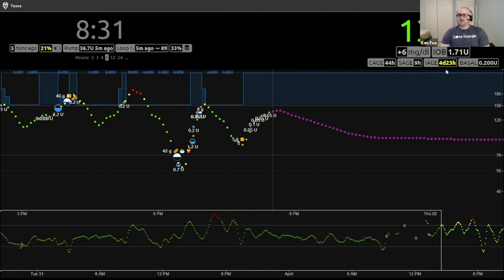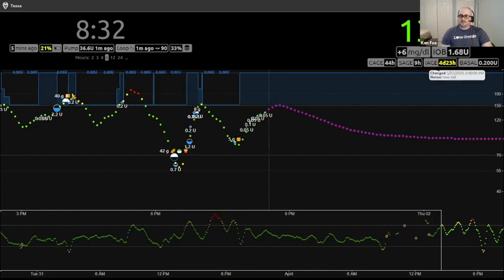Okay. So iAge is more useful for someone on a Medtronic pump that's going to switch out the cartridge, right? So this helps you track the last time you swapped out your cartridge if you use the insulin cartridge swap activity. I, just for fun, log the insulin vials because we have Omnipods. So I log every time we start a new vial. And so the vial is currently almost 5 days old.